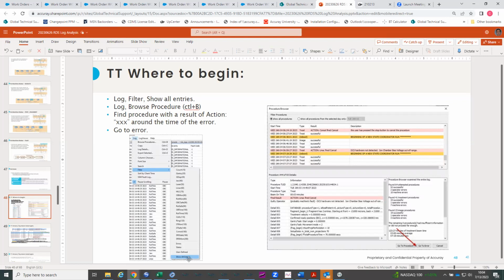In the Radixact logs, they won't show verbose information. They consider it's maybe not something the user needs to see all the time. But for analyzing the logs, there's information considered verbose that is useful for us. So I always tell it to show all entries.